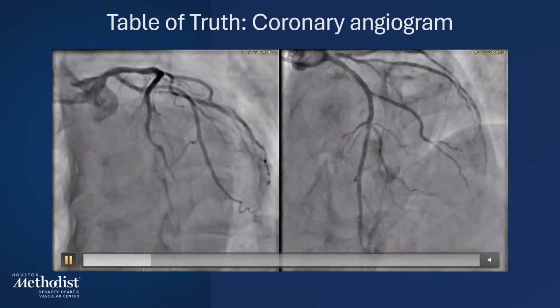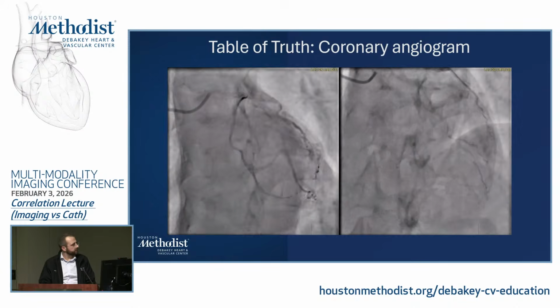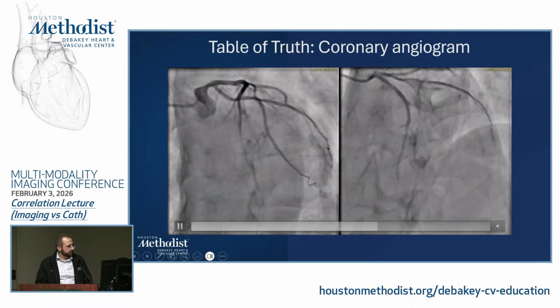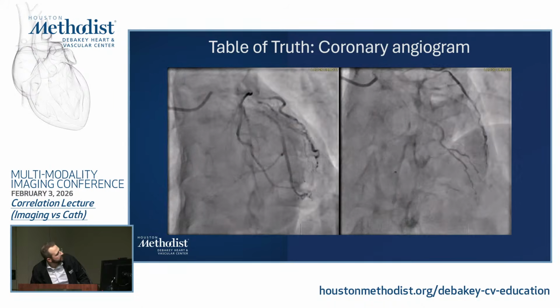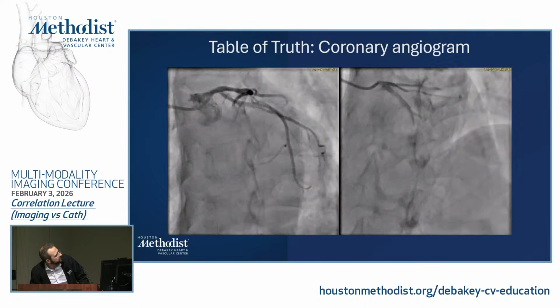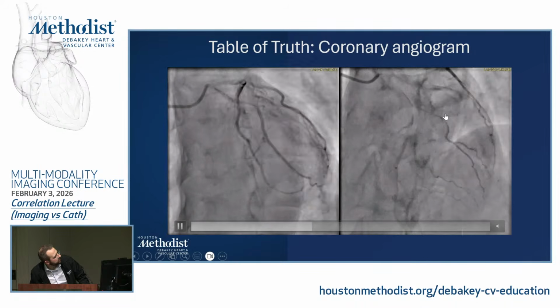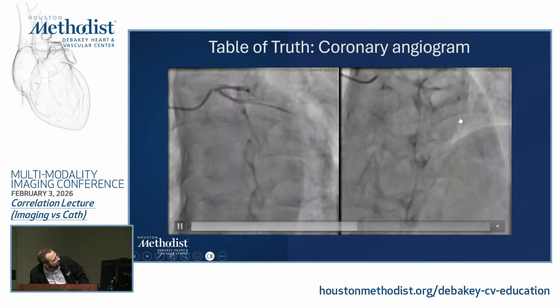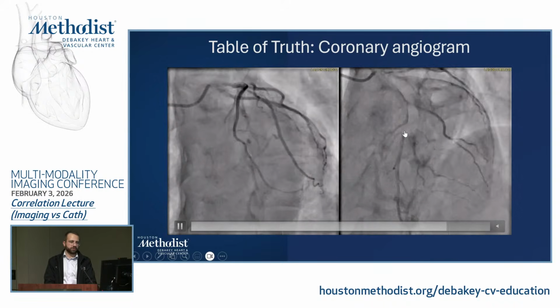They didn't do IFR. You see the lesion right before the second diag comes out. It looks like 50%. They called it 40%. They didn't do any IFR.